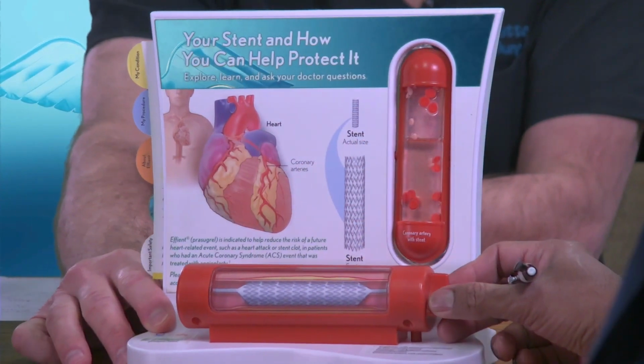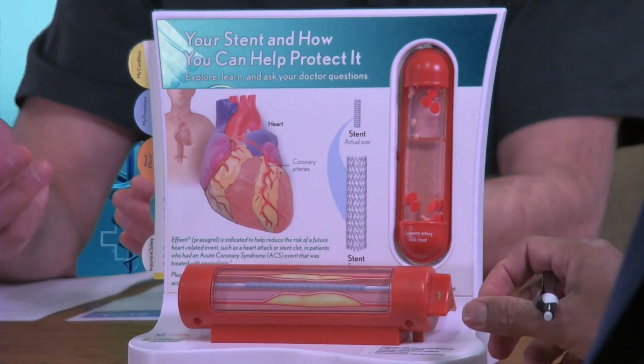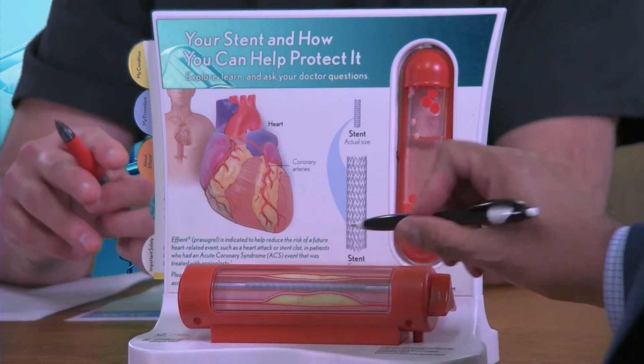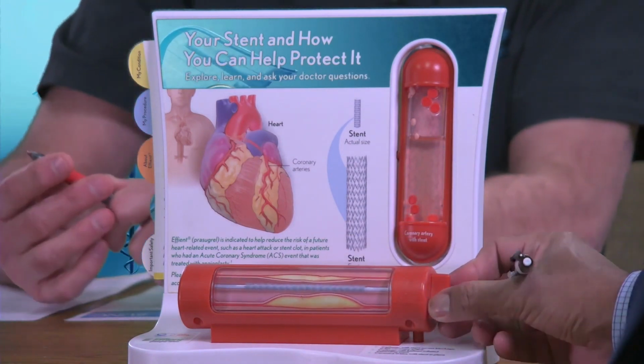Show for us on this model exactly what we were treating, and do we have the ability to zoom in to this model? That camera. Oh, there you go. Great. So this is a plastic model that we're going to use to show you exactly what the pathology was. This yellow thing is the cholesterol plaque. So that's demonstrating the inside of an artery, correct?